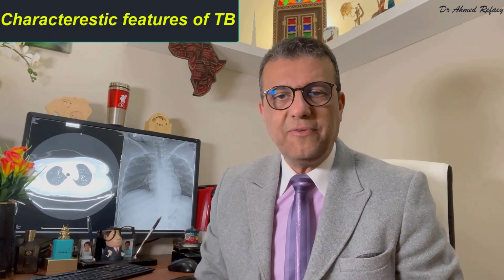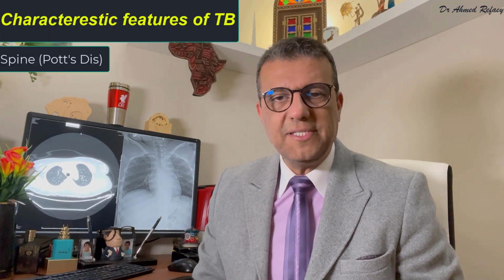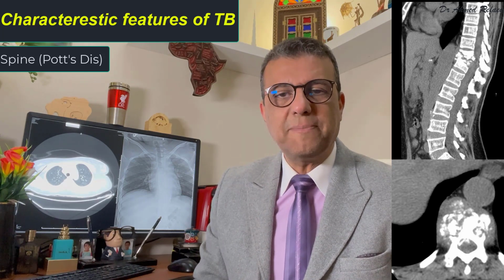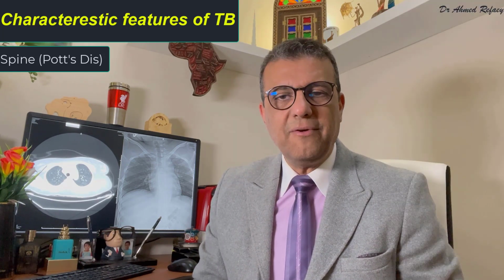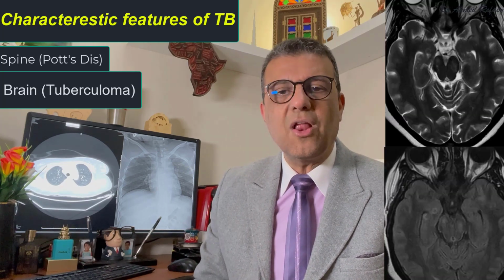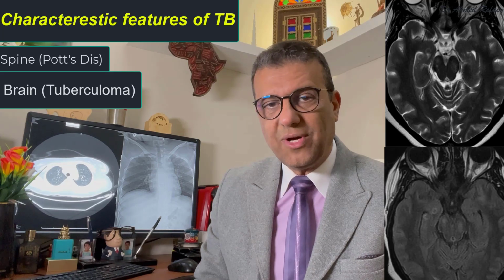In summary, tuberculosis can affect many internal organs at the same time. It has what is known as pathognomonic features radiologically, such as Pott's disease of the spine in the form of destructive end plates with adjacent paraspinal abscess formation. In the brain, by MRI, diagnosis of tuberculoma with characteristic low signal intensity in T2 and in the FLAIR.